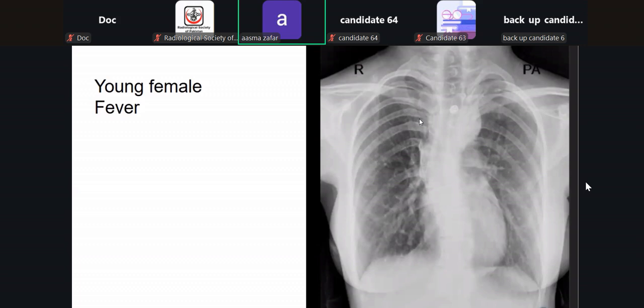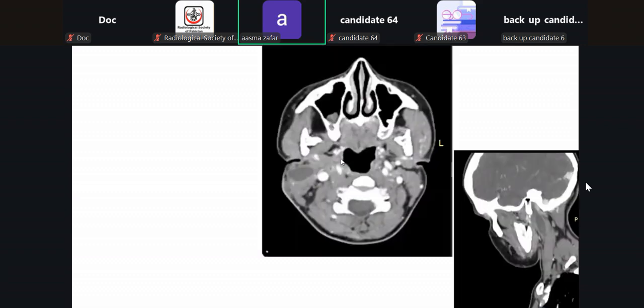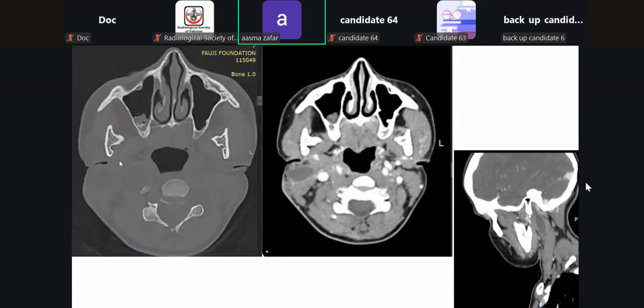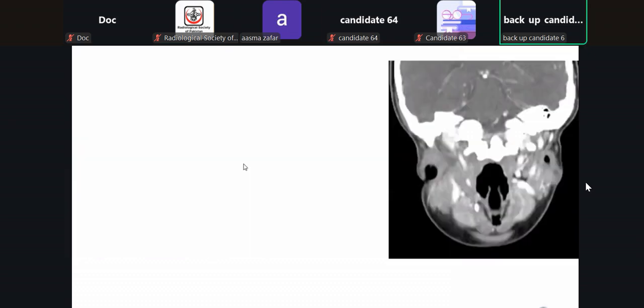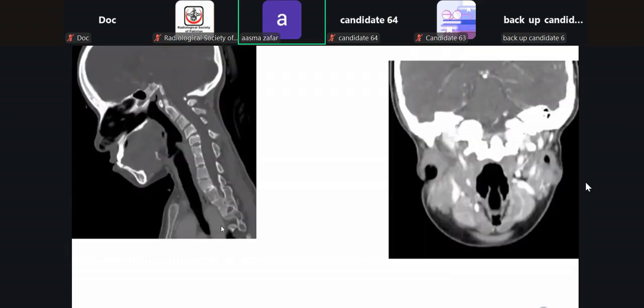On chest X-ray, the posterior ribs are very, very horizontal. These are crowded here and a bit curved. She had an abscess, but what are these? External auditory meatus. Are they normal? Atretic or stenosed. Yes, she had multiple congenital anomalies. Look at the fusion of the vertebrae, and here these were the external auditory canals.